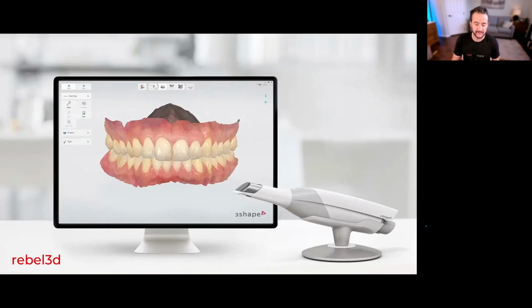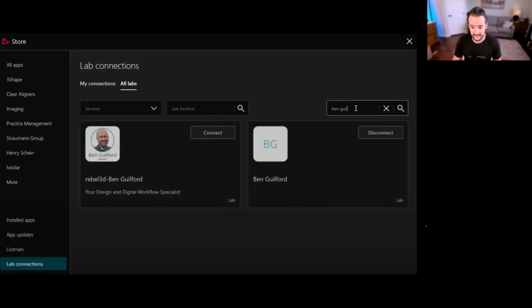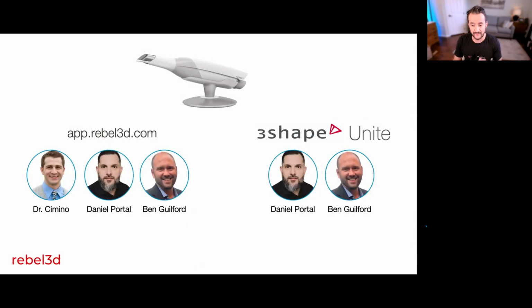Hello, doctor. If you're using a 3Shape TRIOS scanner, there are two different ways to send us a case. First, you can send via 3Shape Unite. You go into your Unite app and you can select either Daniel Portal or Ben Guilford. You just type in their name as a lab connection. You would connect with them and then send them a case via 3Shape Unite.